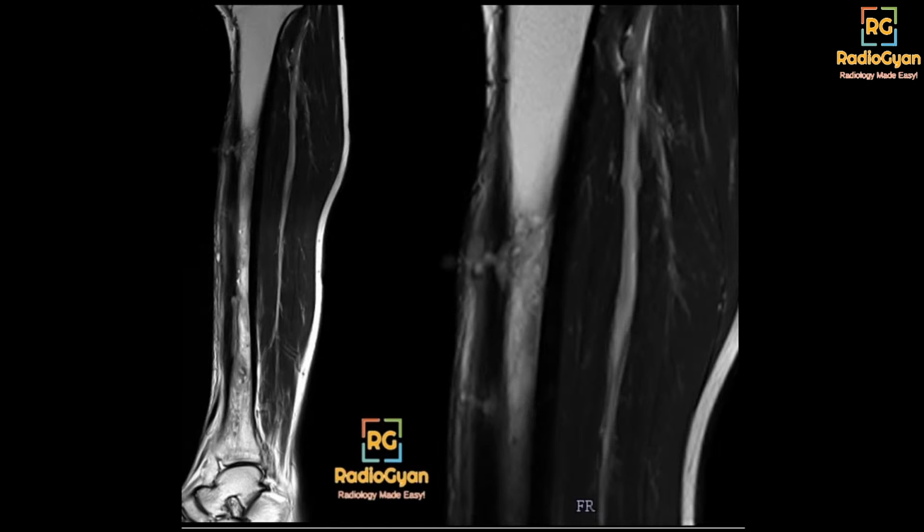Okay, perfect. Try to be more specific. So Aswini mentions osteomyelitis. That's what I assume he means by OM, but there's a more specific diagnosis here. Perfect. So what we see here is that the first finding that catches our eye is this periosteal thickening.